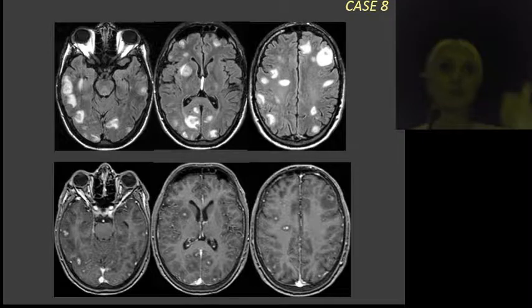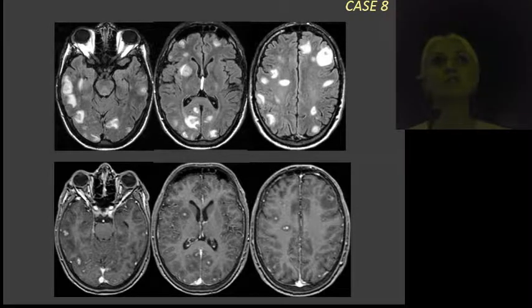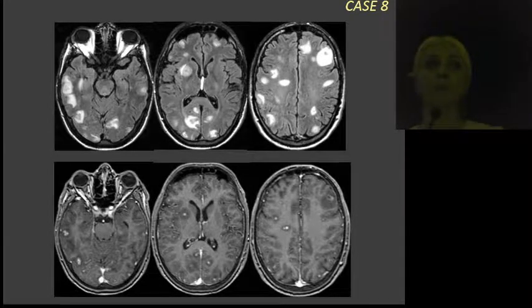First thing, so it's not bacteria. Secondly, they're ring enhancing or nodular enhancing. But the most important in this case is the location of the lesions. Location, I mean, are they in the white matter or gray matter or cortex or middle? Where are they? Now, if you look, they are located in the cortical region, somehow at the periphery and a little bit in the basal ganglia, here and here. And we know now, HIV patient, immune-suppressed patient, dark on T2. What is dark on T2? TB, fungal, parasites.